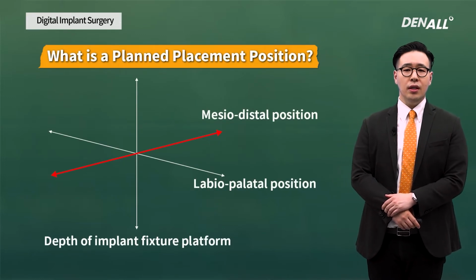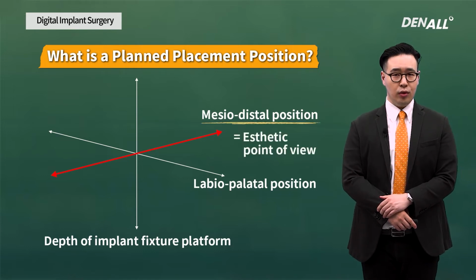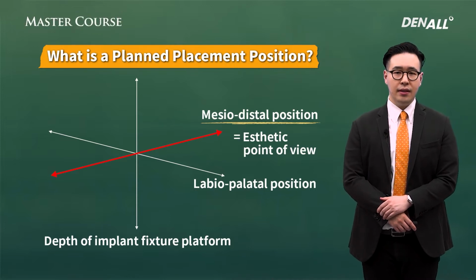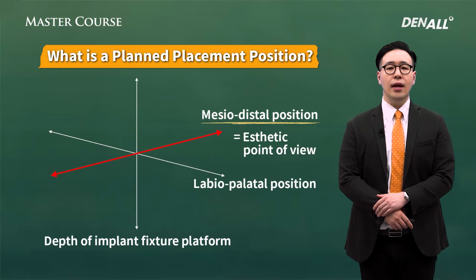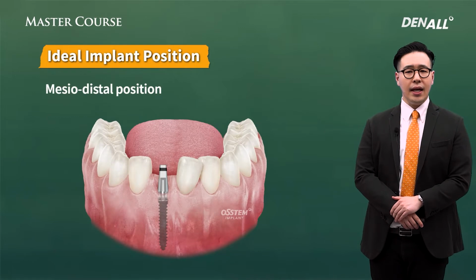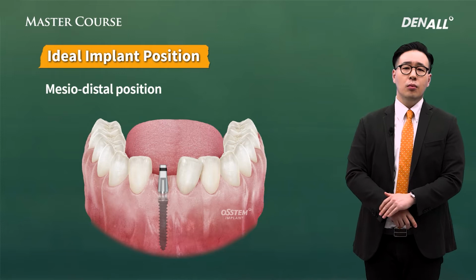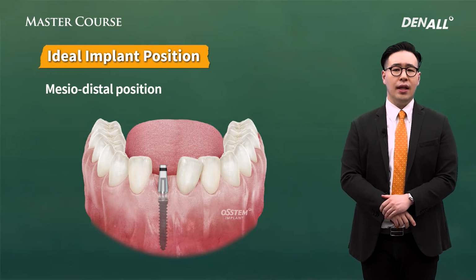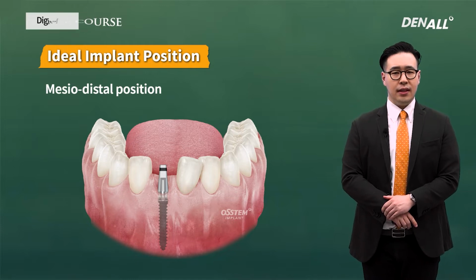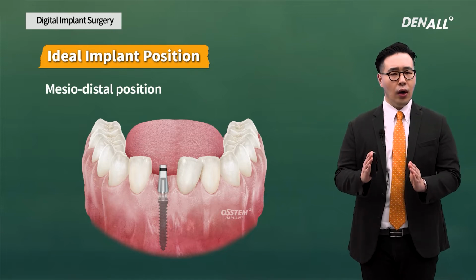Next, accuracy of mesiodistal implant positions can affect aesthetic factors. When many implants need to be placed, the distance between the implants affects the implant's long-term survival. The narrowest space for implant placement can be found in the lower anterior region. In most cases, one-body narrow-type implants are selected. OSSTEM's one-guide system is very helpful in placing narrow implants accurately using the 1MS kit.